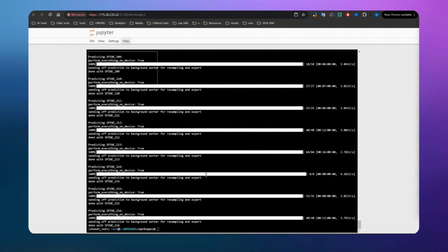Well, so now we are at the end of the prediction. So we have everything, all the cases have been predicted. Now we can do the evaluation of the folder. So this will be the last part of the course.